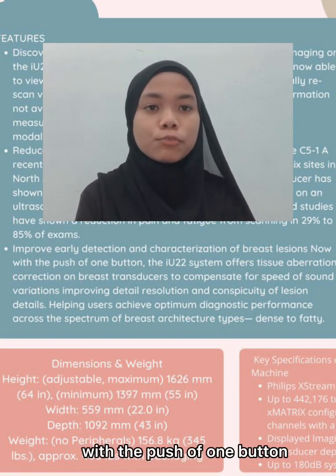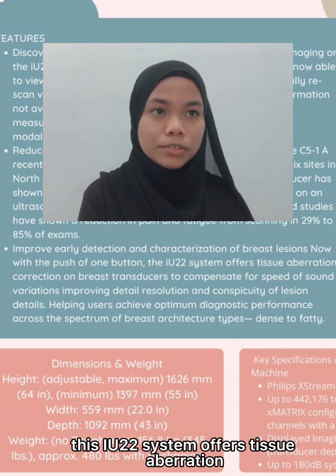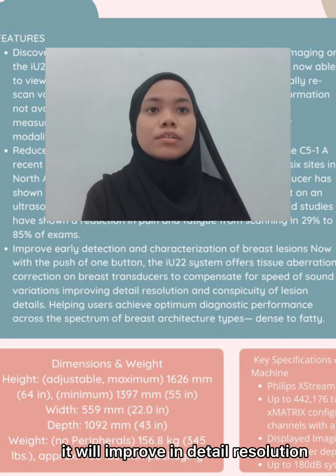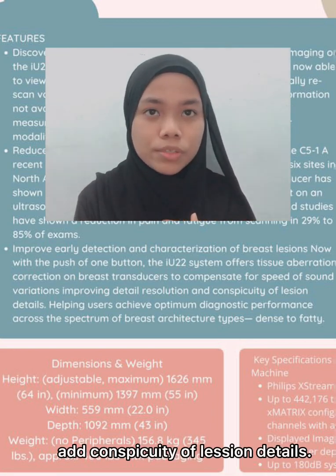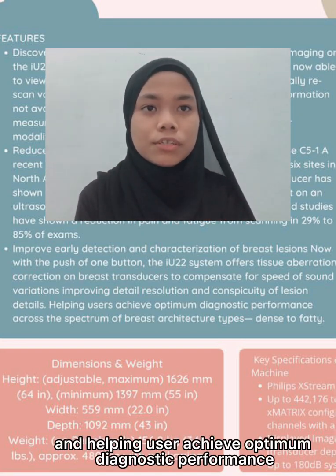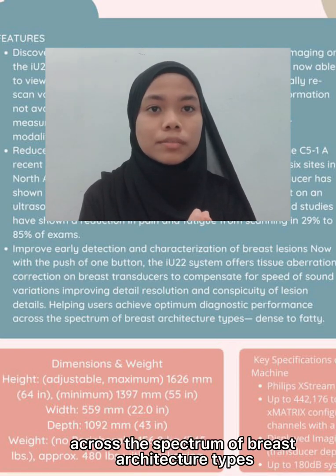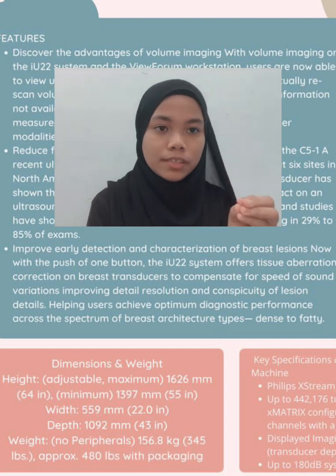With the push of one button, this IU22 system offers tissue aberration correction on the breast transducer. It will improve detail resolution, add conspicuity of lesion details, and help users achieve optimum diagnostic performance across the spectrum of breast architecture types, from dense to fatty.